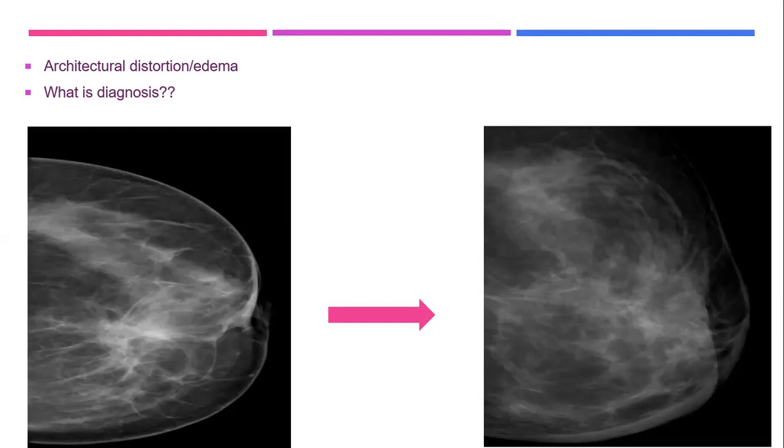Please take it, Abir, because you have taken the same case in a discussion of architectural distortion previously. Same patient, same image. Previously it demonstrated the architectural distortion due to post-operative changes only, and on interval the patient developed breast edema with more distortion and increased density, trabeculation, and skin thickening.